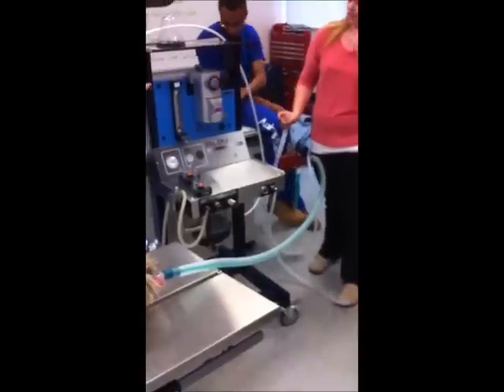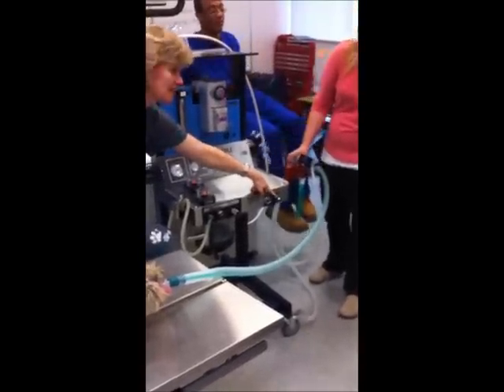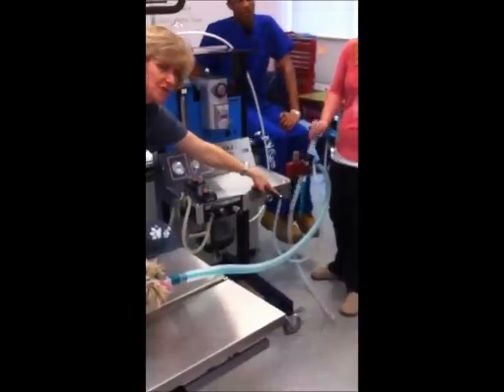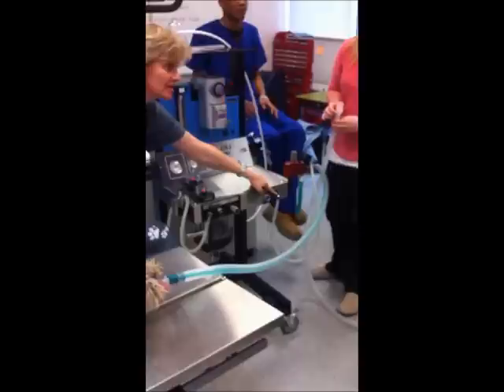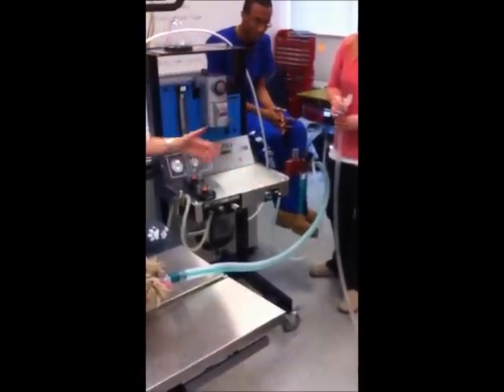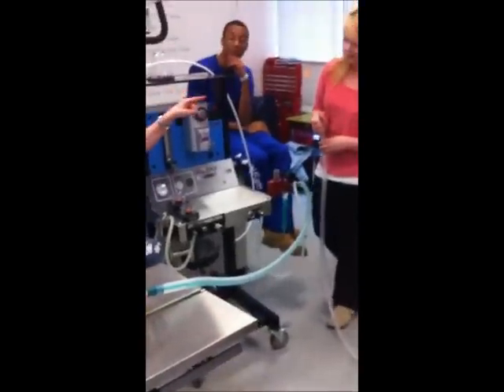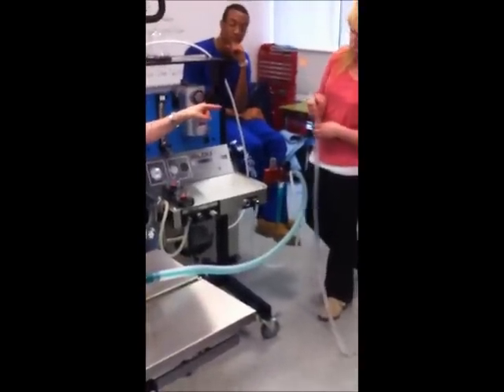No. No. It's only for the bigger one. So that's one thing. Really, once you get to the fresh gas inlet, up to this point in time, both systems use exactly the same stuff. Okay? But as soon as you get here and you're starting to hook up your circuitry, both systems have different setups. And that's one of the most common errors I see students make.